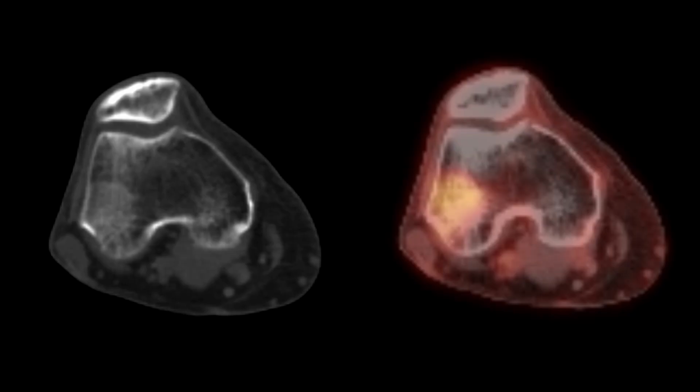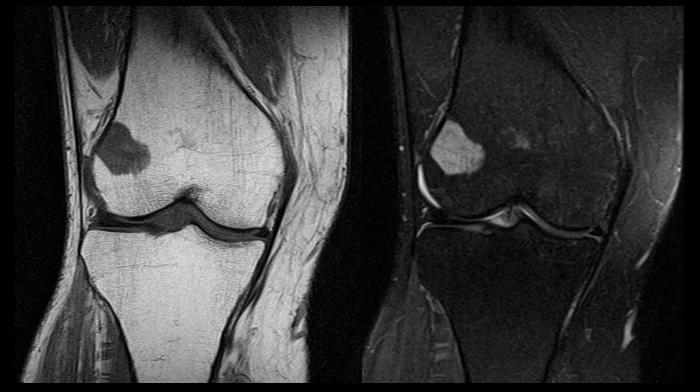When we did a PET CT scan, we see some sclerosis here at the distal femur metaphysis and epiphysis that is avid on PET. And we can see that there is really no disruption of the trabecula. So we're thinking about a very active lesion that does not destroy the trabecula.